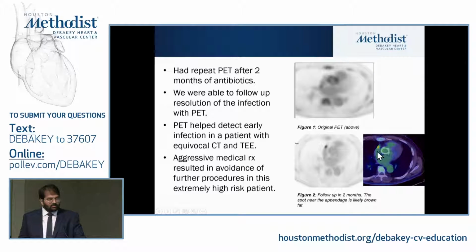I wanted to particularly put this image in because there's a little bit of uptake here. This is an artifact that we commonly see. It's brown fat around the heart, which takes up PET. And an experienced PET reader will know not to worry about this.